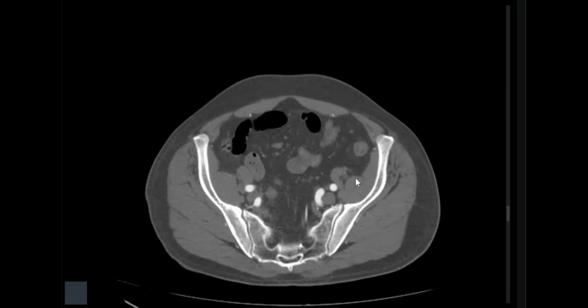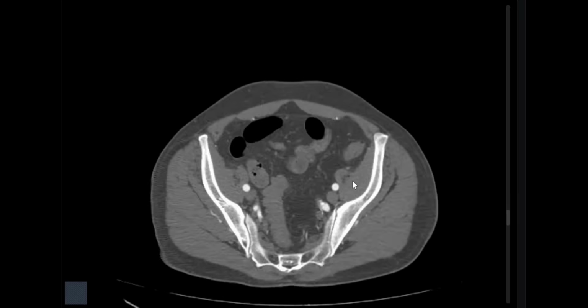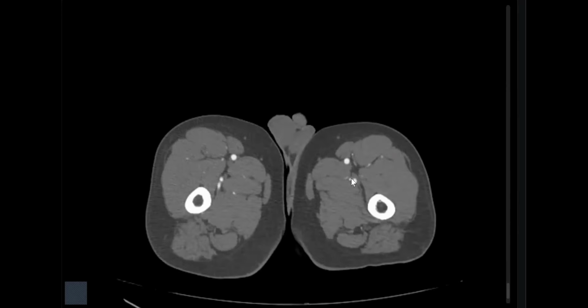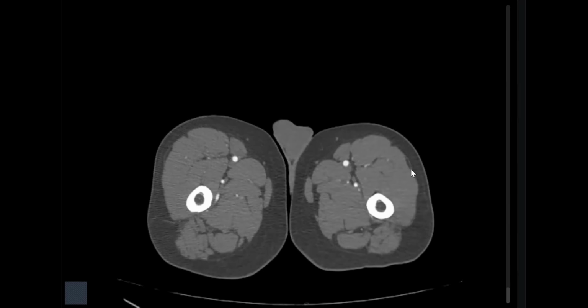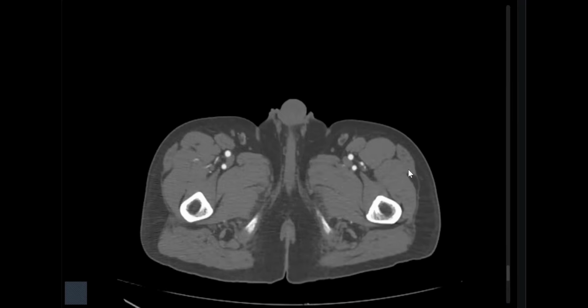And now coming back to the last cut. I know it's routine, okay, but take care, you will lose marks. Maybe iliac tortuosity should be reported in your report. Iliac arteries tortuosity. So please don't forget till the last cut. Sorry for the interruption. You can continue.